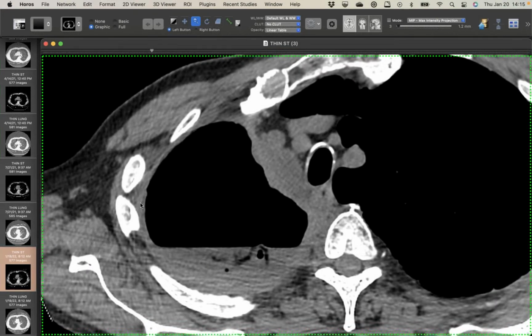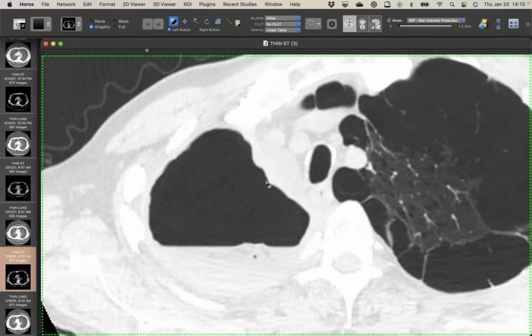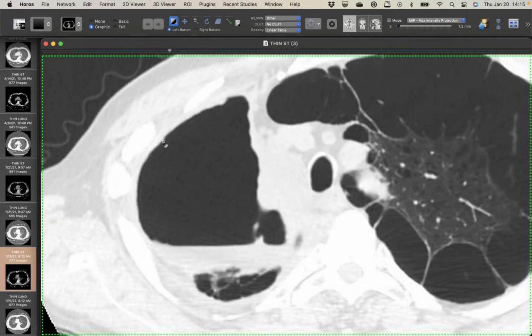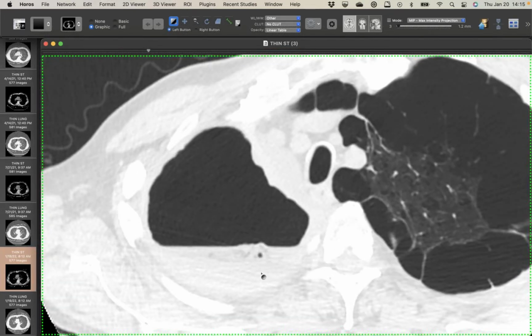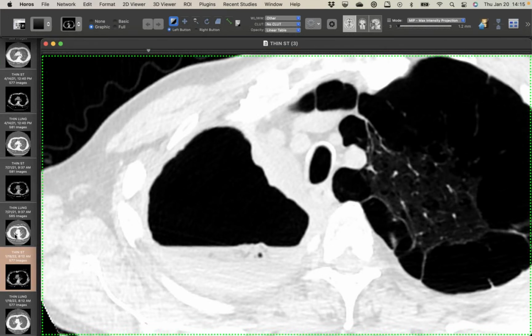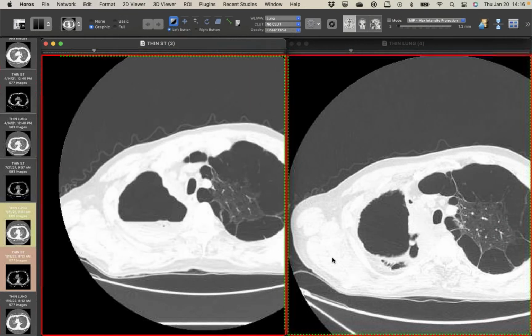And what I think has happened, if we look at the lung windows again, is you'll notice the margins of this are less, they're still nodular, but they don't have that fine appearance. I think the lining or some of the lining of this cavity has sloughed and has fallen into the cavity and is just hanging out there. So if I go back to the comparison scan, I think this material here all sloughed and is necrotic lung.